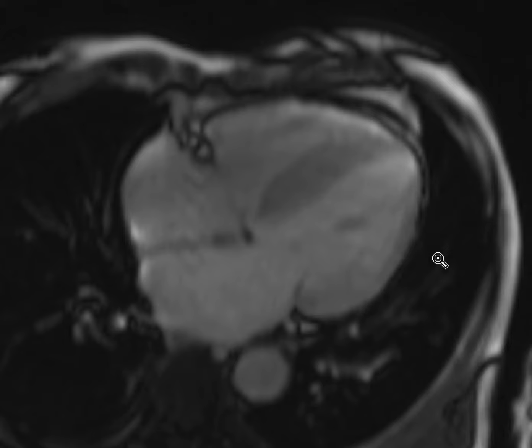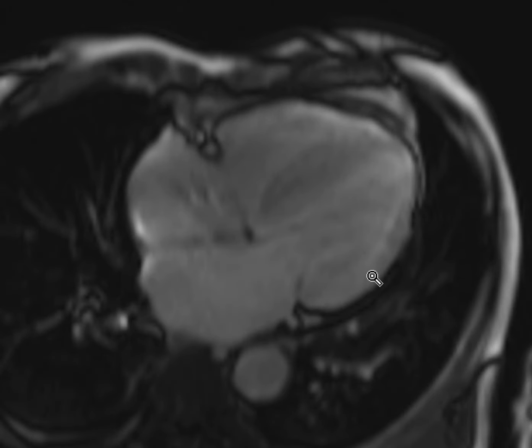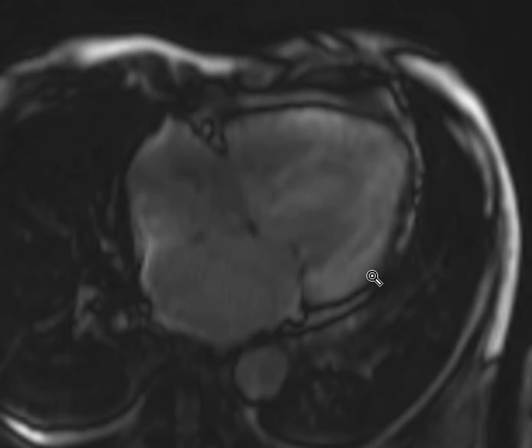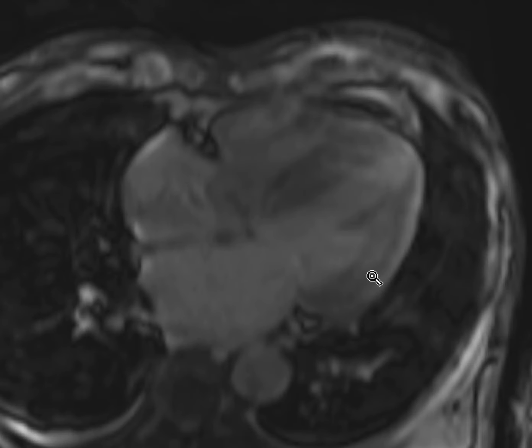Usually, in normal subjects, the blood reaches the nulling point before the myocardium. So in normal subjects, the blood will turn black and dark before the myocardium. So let's see whether this kinetics applies in this case or not. So if the blood gets darker before, I'll just move to the correct side.